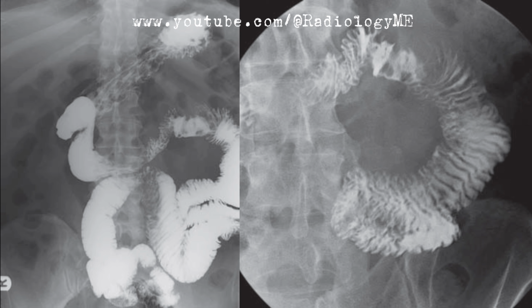If this were an adenocarcinoma or a carcinoid tumor, I'd expect to see more definitive signs of malignancy, but these are still on my differential list. To confirm my diagnosis, I'd suggest a biopsy via endoscopy. Given the location of the lesion, the duodenojejunal flexure is usually accessible with conventional endoscopes. I'd also consider a CT scan for a better look at the surrounding structures and any potential lymphadenopathy, which would be crucial in staging if this is indeed lymphoma.